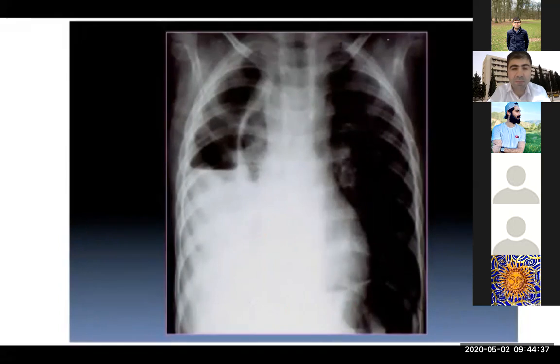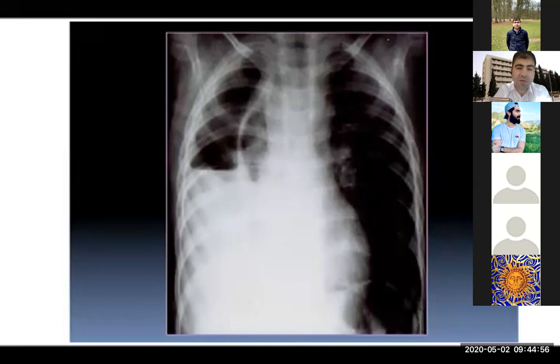Yes, I see the cardiac shadow. Yeah, so this is the margin of the left cardiac shadow, right? Yes. What's about the right side? It's not clear. Okay. So there is one finding according to the cardiac shadow or right cardiac border. And so what's about D? D for the diaphragm. It's not showing. Which hemidiaphragm?